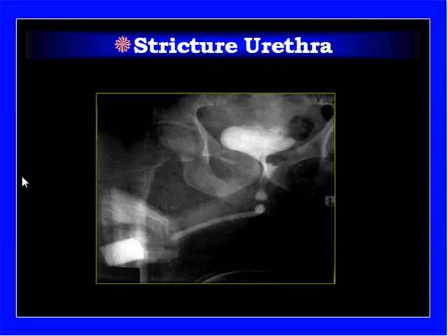Another case of stricture urethra. This is a tight stricture urethra, but still the contrast has forcefully gone into the urinary bladder retrogradely.